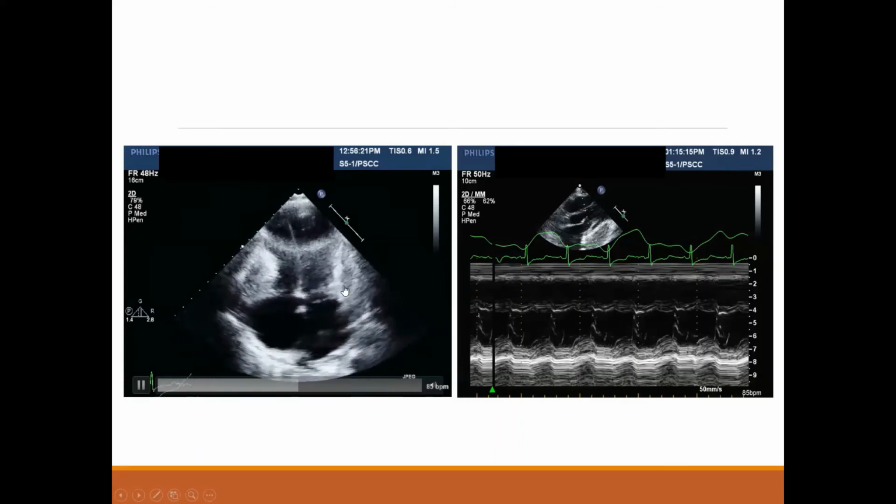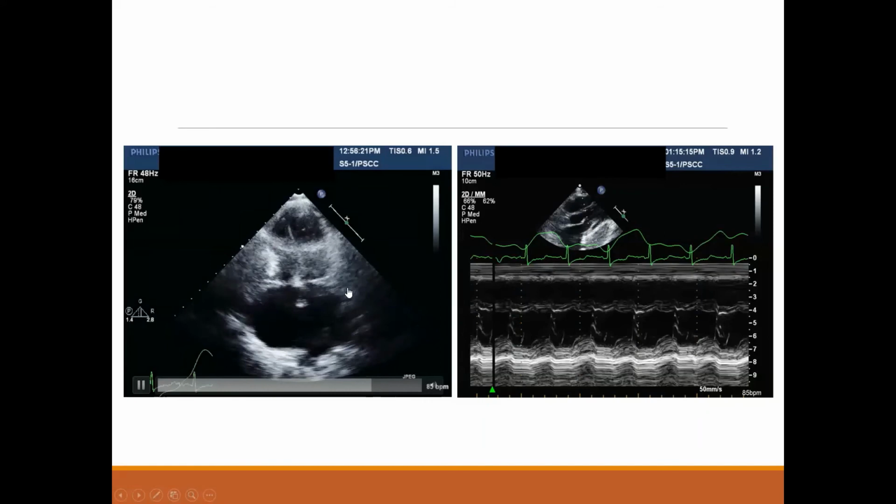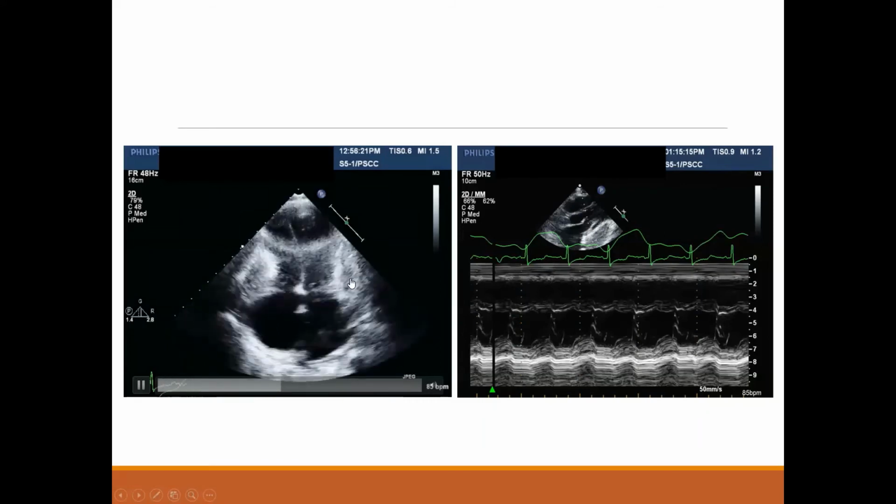Of course, in the echo it's very hard to assess the pericardium and how thickened and calcified it is, okay? But this is the geometrical imprint of advanced constriction in echo. So if I see this image, I probably don't need a lot of hemodynamics because this is advanced constriction anatomy. Okay.